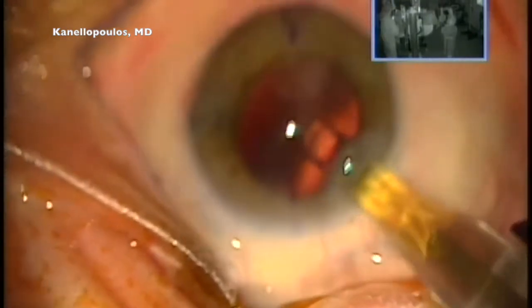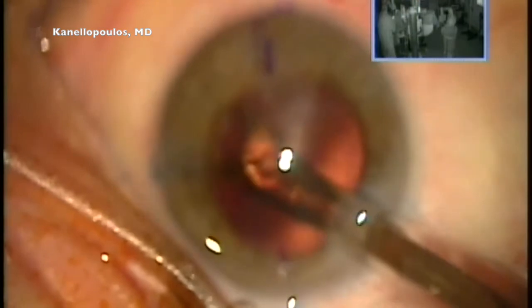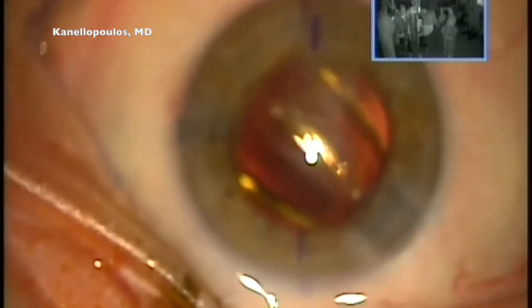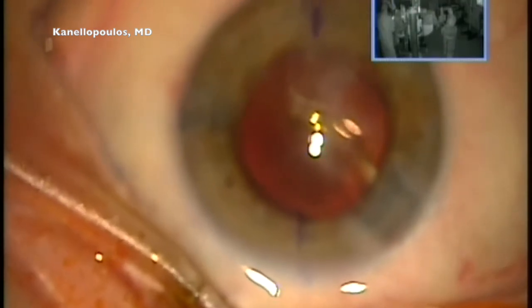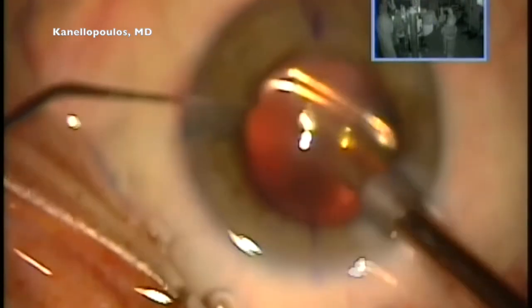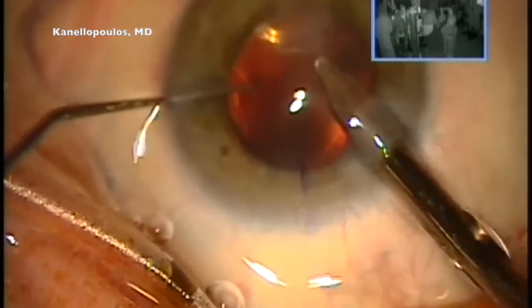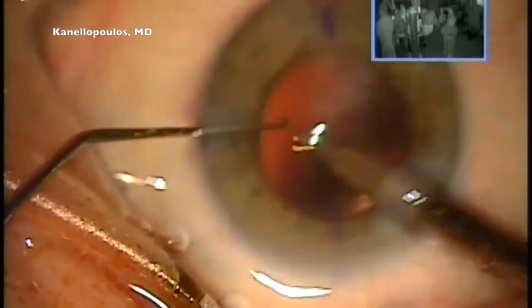We've been adopting the toric IOL back in 2006, and we might hold an international record currently, as 95% of our patients do enjoy the implantation of the toric IOL in our practice. I feel very strongly about leaving the eyes at most half a diopter with the rule. So even if we encounter a patient that's half a diopter against the rule, I will invariably try and switch that to a mild with the rule astigmatism.